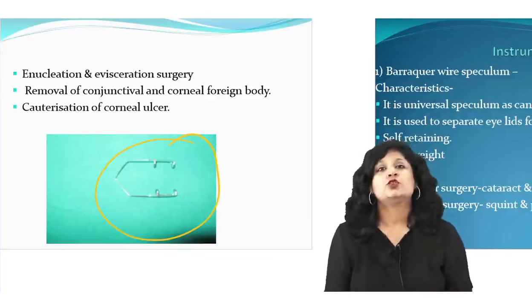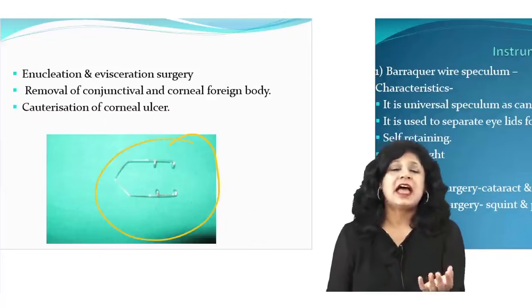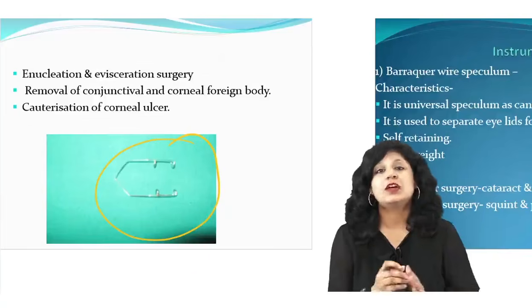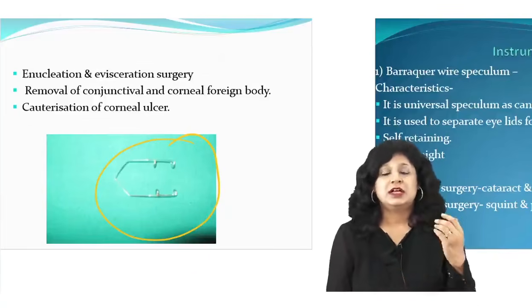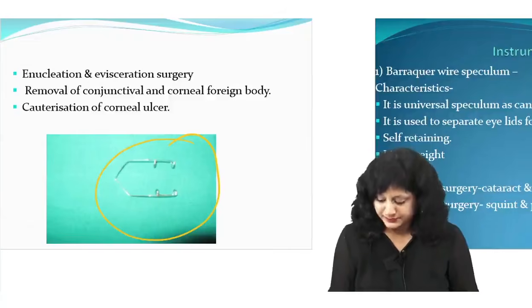So that time also we use it. Then the third important thing is corneal ulcers. We get a lot of cases of corneal ulcer, especially bacterial ulcers. At that time also, when we want to do the cauterization of the ulcers or remove the corneal debris, we use these speculums.